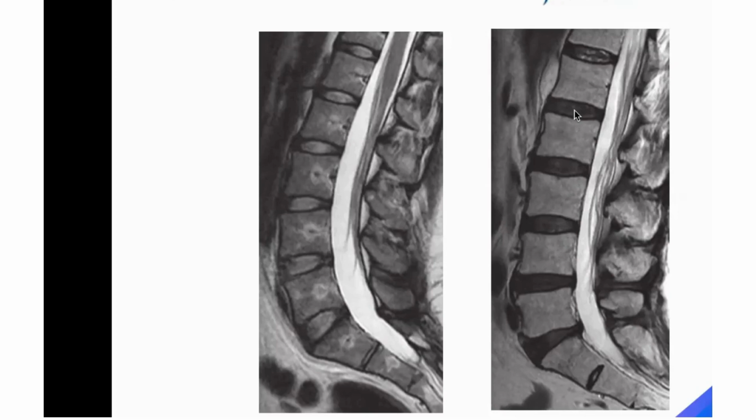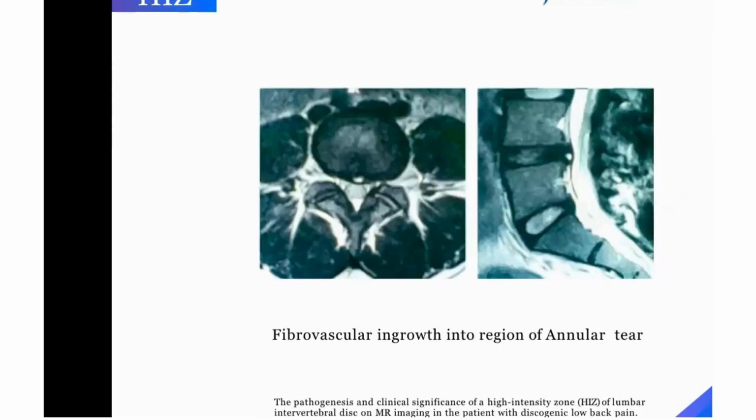But these discs are usually not painful because annulus is intact, end plates are intact. So every dark-looking disc is not painful. Understood?